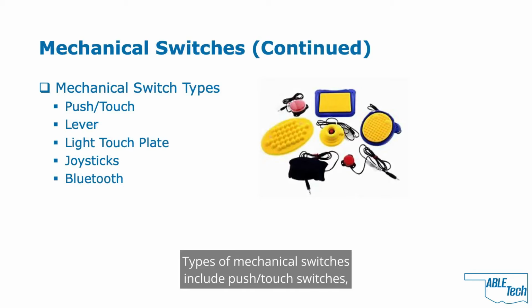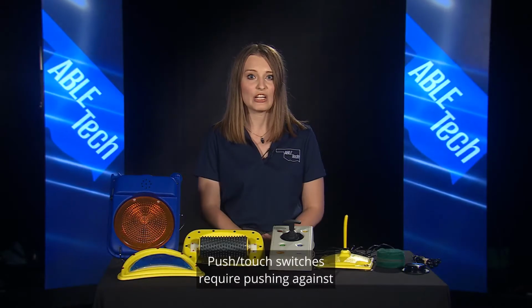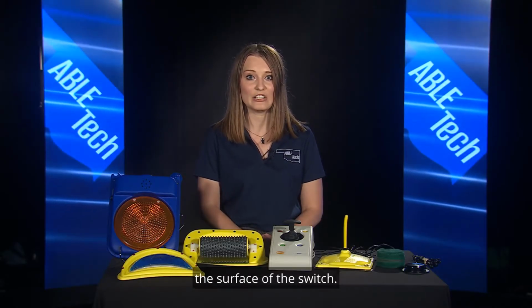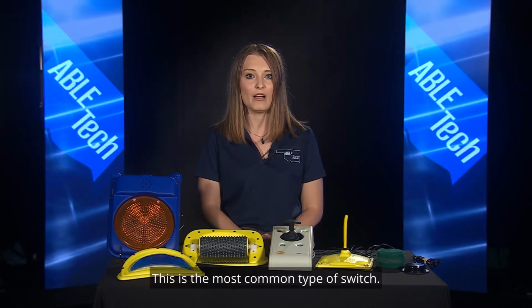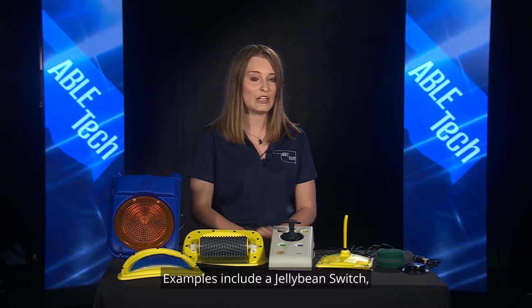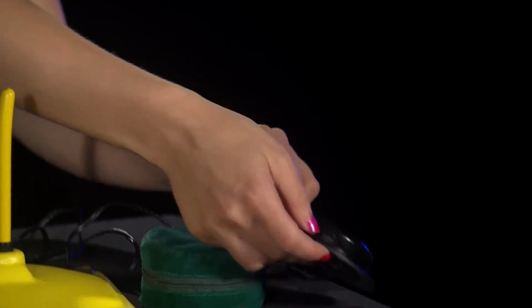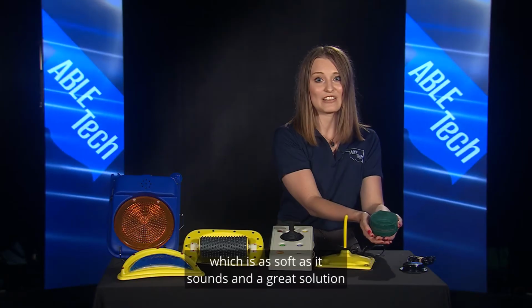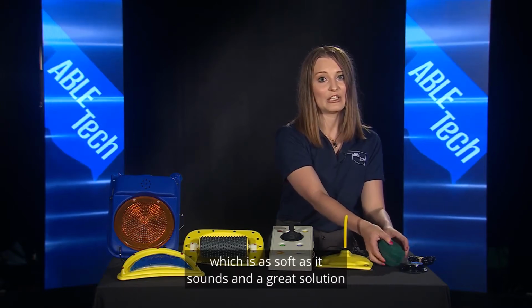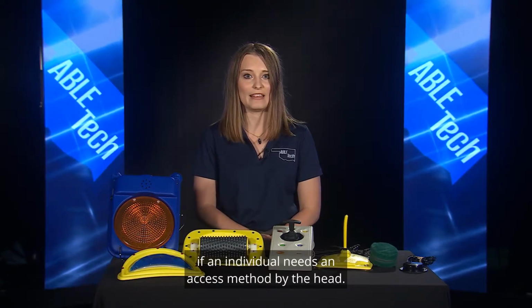Types of mechanical switches include push-touch switches, lever switches, and joysticks. Push-touch switches require pushing against the surface of the switch. This is the most common type of switch. Examples include a jelly bean switch or a pillow switch, which is as soft as it sounds, and a great solution if an individual needs an access method by the head.